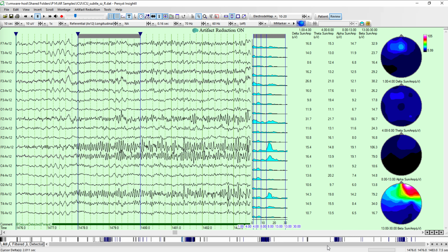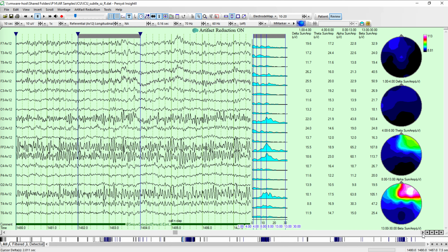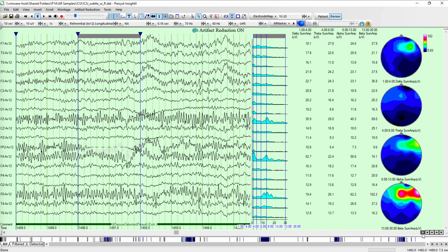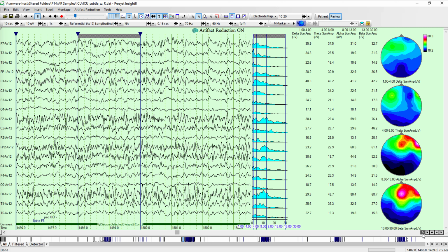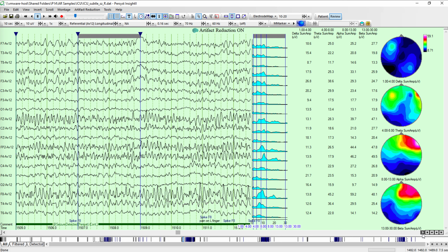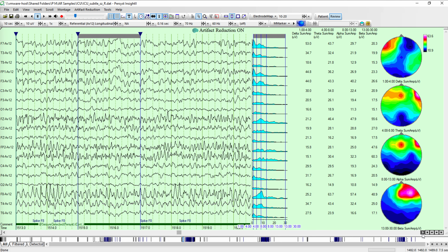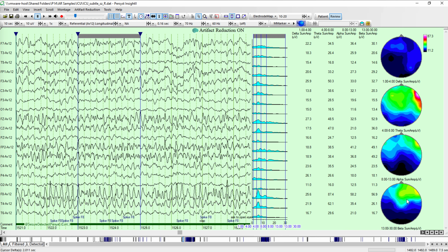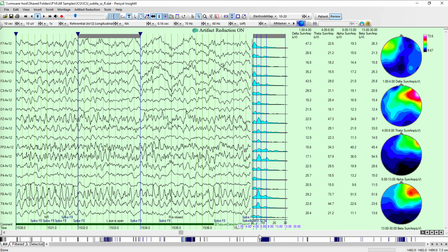Let's go ahead and apply this map as we step through. And again, we'll see that color change happening and then making its way down from beta to alpha, down to theta as that seizure evolves. And again, since we're using the sum, we see that the contribution of the high faster frequencies is still showing up in this. And we can change that.